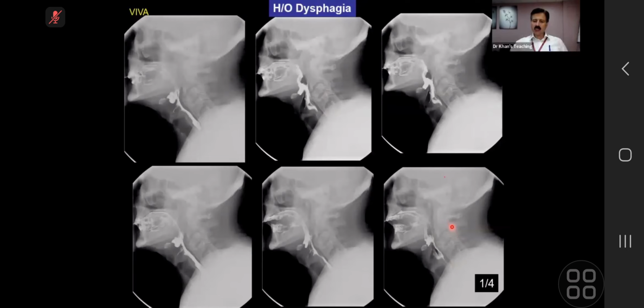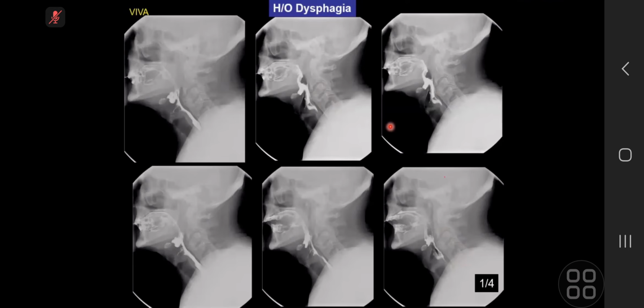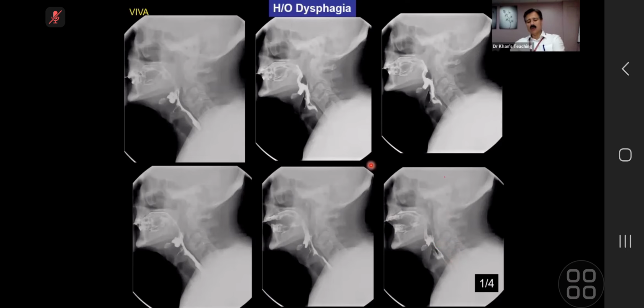You know, the posterior elements, etc., are absolutely fine. Look at the intervertebral disc; they are absolutely fine. Yeah. So anterior longitudinal ossification. What is your diagnosis then, please? Ankylosing spondylitis. Ankylosing spondylitis will cause syndesmophytes, which will be just here. This is too big. Okay, I will take over.